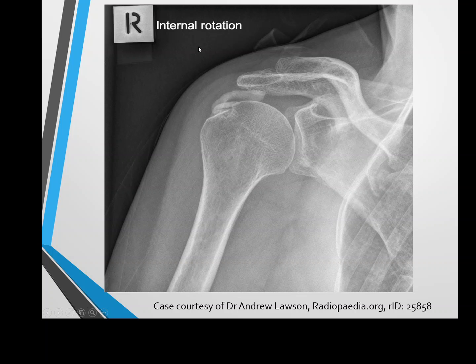Here we have, this is obviously an x-ray of somebody's shoulder, and you've got the muscular tendinous junction just here, and then of course the rest of the tendon of the, this will be obviously supraspinatus muscle, basically all of the tendon leading down to the insertion of the muscle on the proximal humerus, is all of that is turned into very, very dense calcific tendinopathy.